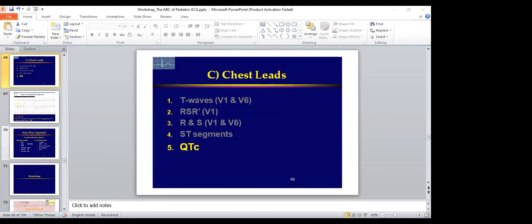So what is peaked T wave? ECG features of hyperkalemia are peaked T wave. There is P wave widening, followed by flattening, followed by PR prolongation. If we do not intervene, there will be bradyarrhythmias related to sinus bradycardia with high-grade AV block, leading to conduction blocks, bundle branch block, QRS widening with bizarre QRS morphology. These cutoff levels at various levels we are going to see. Let us see with the ECG.